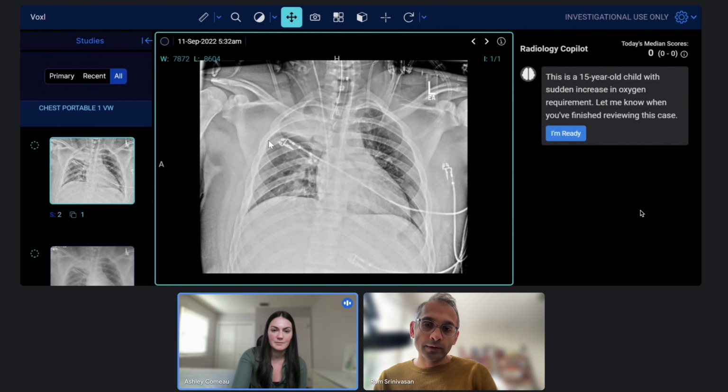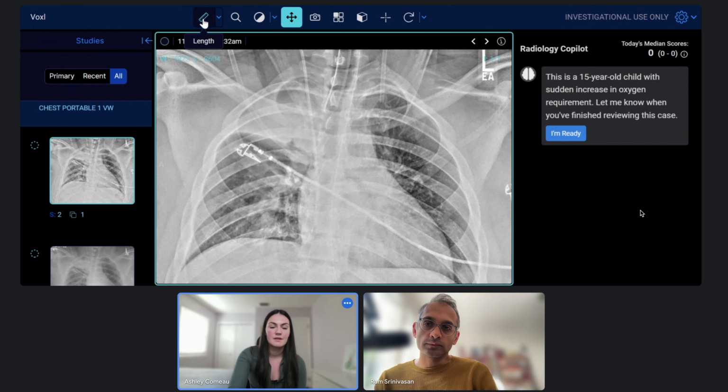This is a line placement radiograph that is just more suitable to helping you see the lines. They're just easier to differentiate on this. Those are electrocardiogram leads. We can see an ET tube here. So there's a little tool over here so you can measure to make sure that it's the appropriate length that you would want. You can see it's about 5 centimeters.